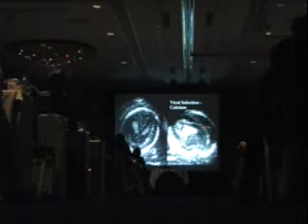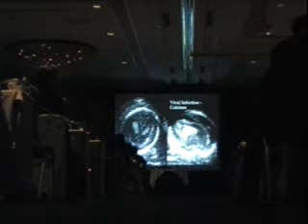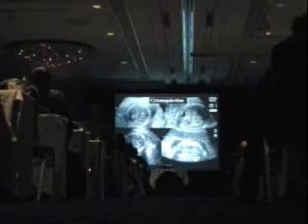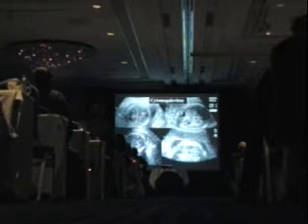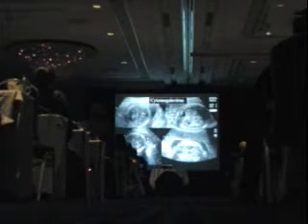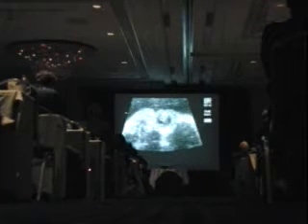What there is, though, is a ton of calcium in the brain parenchyma throughout. This fetus developed severe microcephaly. Didn't do well at all. This is another cytomegalovirus case, with, in this case, areas of calcifications throughout the brain, and also a very abnormal cerebellum, smaller in one hemisphere than another, a very severe abnormality.